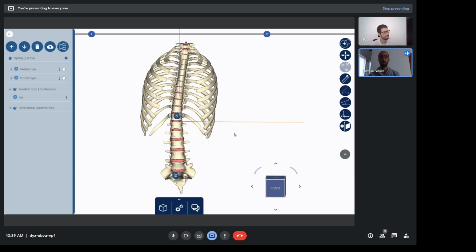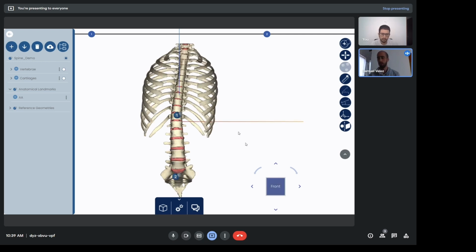You will be able to create a set of anatomical landmarks with predefined names, as is done in cephalometries, and the application will create the planning or the cephalometry for you, and it will be dynamic. So you will see the changes as you translate or rotate a specific part, and see the change in the dimensions, in the angles and the distances.